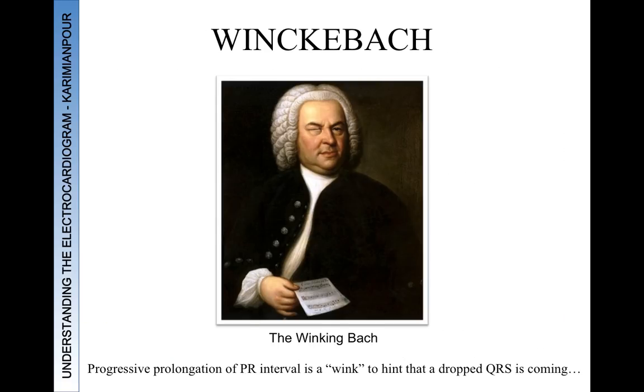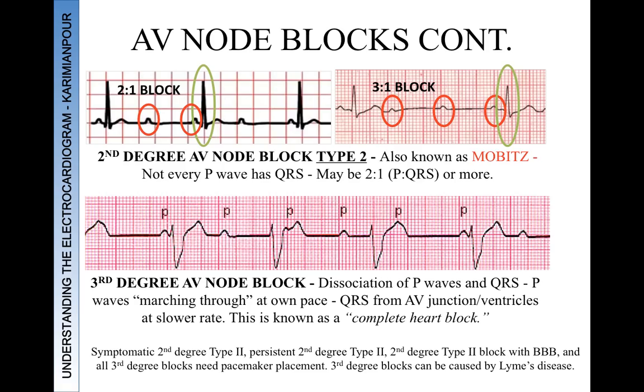The way that I remember Wenckebach is the winking Bach. So this is Bach and he's winking at you, and it's telling you that there's progressive prolongation of the PR interval, and it's a wink or a hint that a dropped QRS is coming. So that's one way to remember what a Wenckebach is from the Mobitz.